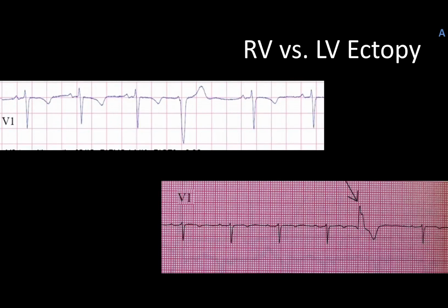As promised, a deeper discussion into PVCs, and that's what we're discussing here. What we're really going to go over is, can you tell if the PVC came from the left side of the heart or the right side of the heart? And I can honestly tell you, yeah, there's a number of clues you can pick up on that'll really help give you a strong indication of which side of the heart was responsible for generating that beat. And so here's how it works. First off, you have to use V1. That's the first thing. So we're not looking in lead 2, we're looking at V1. That makes sense because that is laying right in front of the heart and measuring any electricity coming out through those ventricles.